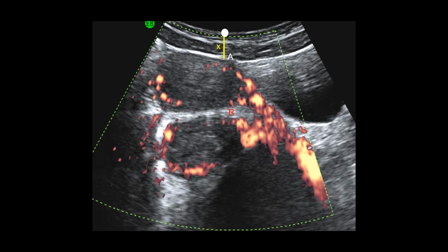This was one way of interaction between the ultrasound waves and the tissue at point A. We'll see now another scenario of interaction, because we are having here a strong reflector at R, probably caused by the distended rectum with gas inside it. And because not all the ultrasound waves will be reflected at A, some will pass through A and reach the strong reflector.